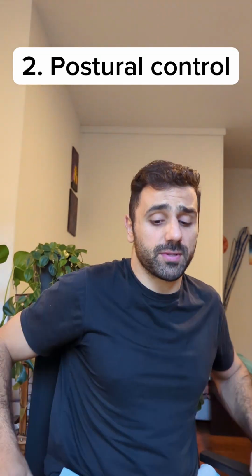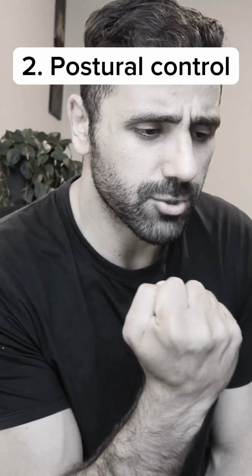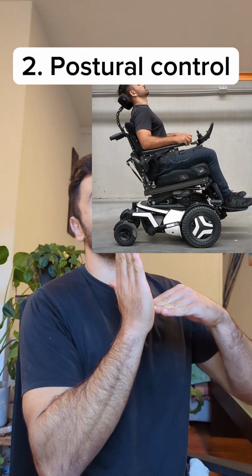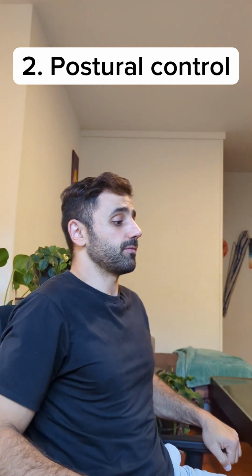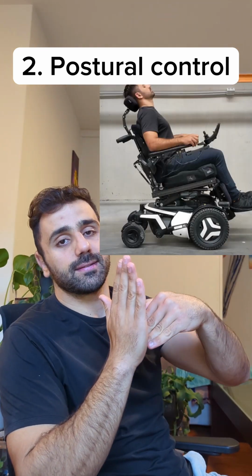and the head support. Number 2 is postural control, because when we sit up, all of gravity's forces are trying to make us crumble. Bloody gravity. So, for clients with limited trunk control, going into tilt can make them feel a bit more supported when they're in the chair throughout the day. It can also play a large role in preventing someone from sliding forward, because now we're tilting, gravity is actually helping us stay back into the chair.